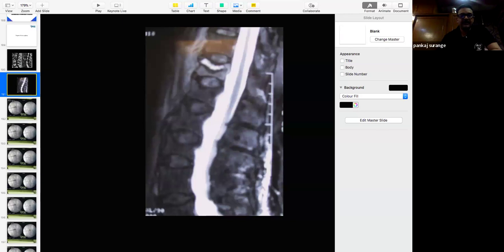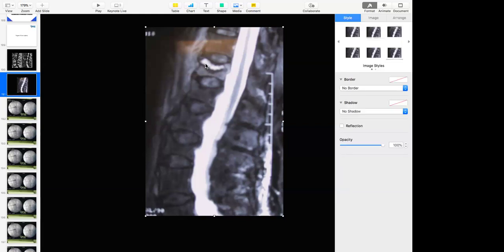Guys? Are you there? Yes, sir. Right? So this is what? This is fluid filled cleft. Yeah. Okay, there's a cleft which is filled with fluid. If the sections are taken within like 5 minutes of the patient lying, within an MRI, this may be dark also. Okay, understood?